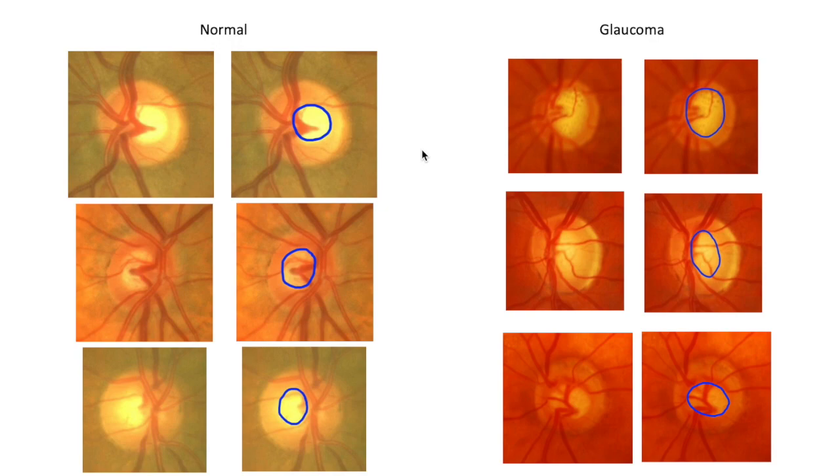Now, I'd like to point out that since I manually traced the optic cup, I had to only analyze images in which the edge of the optic cup was obvious, and I interpolated that optic cups typically have a round shape. Now, for those who will segment the optic cup using computational approaches, the edges of the shape will be much more jagged because the computer can pick out more detail than the human eye can. But that doesn't change the effectiveness of ShapeGenie. It just changes how the shape indices should be calculated from the resulting data, which I will talk about in a few minutes.